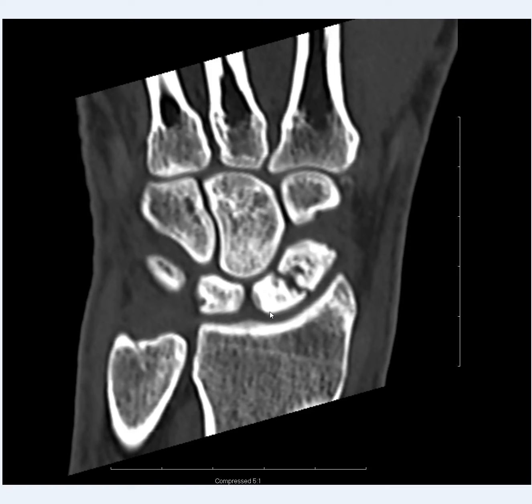Like the radiographs, what is diagnostic of this type of tear on a CT scan is greater than 3 millimeters of space between the articulation of the scaphoid and the lunate bones. This was not visualized on any cuts of the CT, and again, CT is not very sensitive for this type of evaluation because CT is better at evaluating bones than it is soft tissues. If we wanted to be sure about whether or not there was a ligamentous tear present, we would order an MRI.